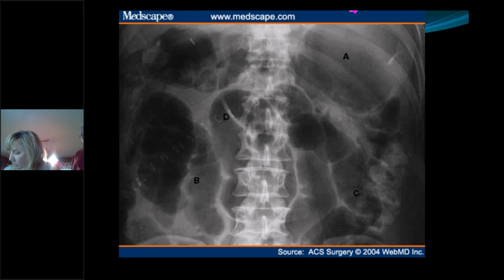This person has a huge ileus, certainly decreased narcotics, ambulation, maybe some stimulant, whether it be suppository, things like that would be very reasonable. Some people had mentioned, hey, throw an NG tube down this guy. And my question to you guys is, if you do that, is that going to decompress the intestine? Because you're putting a nasogastric tube in, meaning that it's going to float around in the stomach. Is this problem in the stomach? And the answer is no.